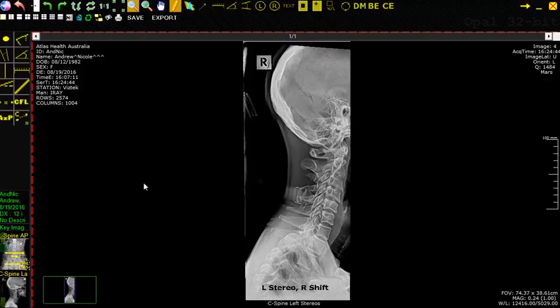Okay, good. So for any of the Blair docs who are looking at this, part of it's just how I've learned to do x-rays. When I have my left stereos, the patient is facing the right, and when I do right stereos, the patient is actually facing the left. So if you can forgive me of that, nevertheless, everything is properly marked here.